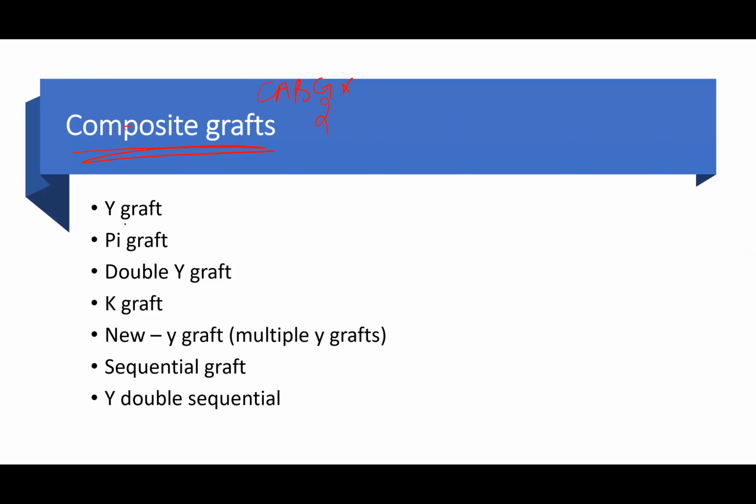It was a sequential graft where there was a graft coming down from the aorta. So this is the aorta, and there was a graft here like this. When it comes down, it touched this PL branch.